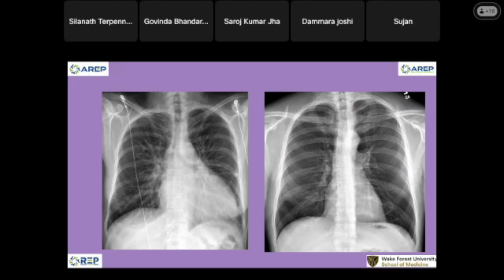AMI. Oh, don't be so confident. Sometimes it may not. It may be just volume overload. Yes, that is one common cause. When we read chest radiograph, we don't go into the detail like that. If you really want to do that, you have to dig into the medical record carefully and say that in your report. But I don't do that because we read 200 chest radiographs per day. We cannot do that. We have to go quick. So we normally say, okay, likely this.